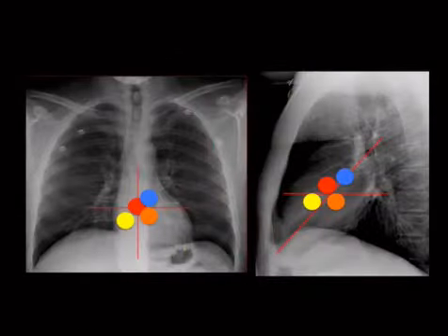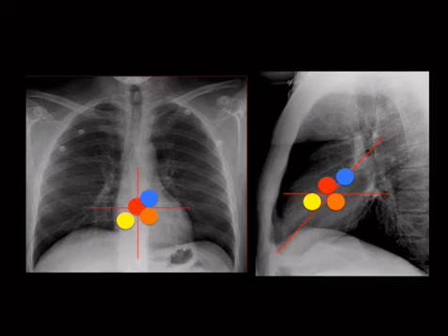So speaking of valves, this is another thing that makes for great multiple choice, which is which. What valve is that? A, B, C, or D, right? So you need to know this. So let's go through them.